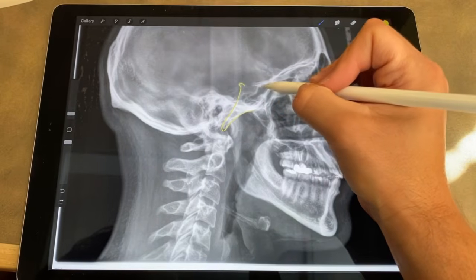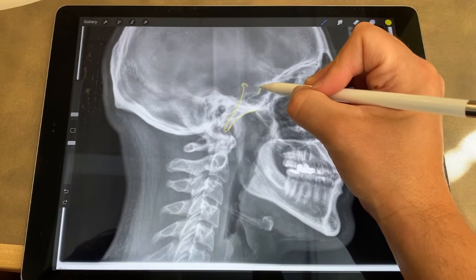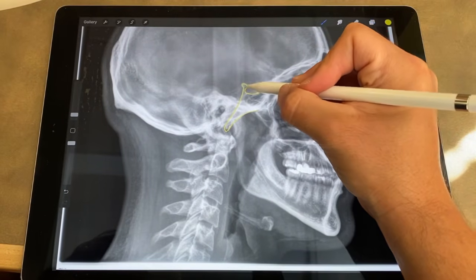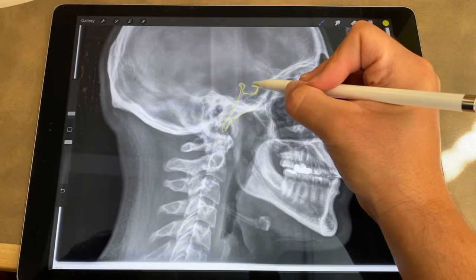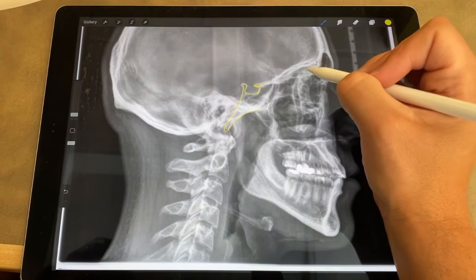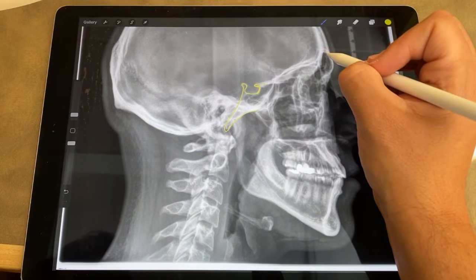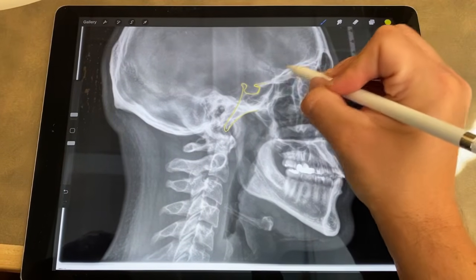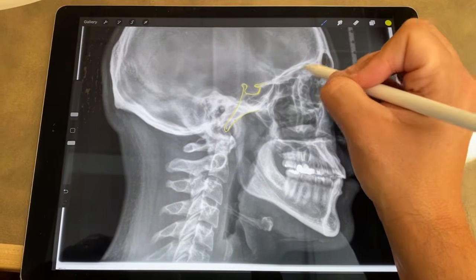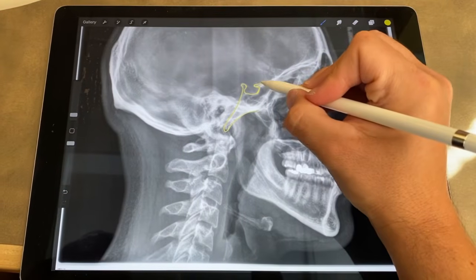How it's just right there. And then here's the anterior clinoid process. And then you can see the wall right there of sella turcica. Kind of bring that up, connecting there. And then you have that anterior clinoid process. Now remember, you have the anterior cranial fossa, right? Now there's multiple lines right here because the anterior cranial fossa is deeper in the middle and higher up on the lateral portion. So that's why that's like that.